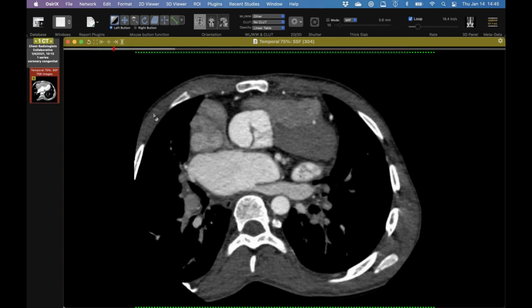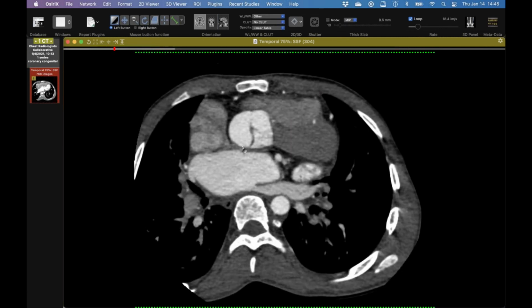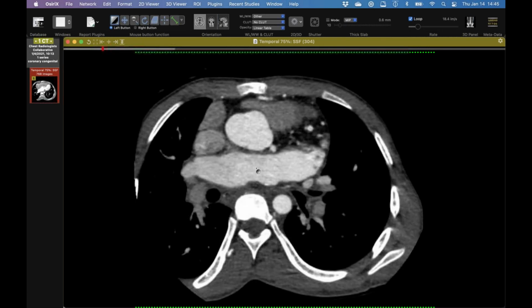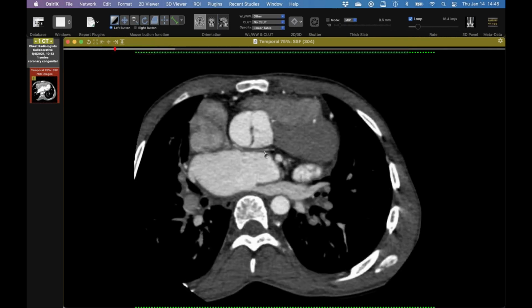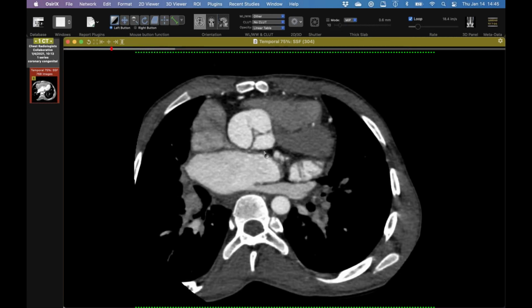And you can see this patient's already had a sternotomy, little tiny baby wires, so had some kind of congenital heart disease. So that might explain the coronary anomaly there. And you can see there's a big juicy, it's a left dominant system, so the PDA comes off the circ there. But just two kind of fun coronary variants.